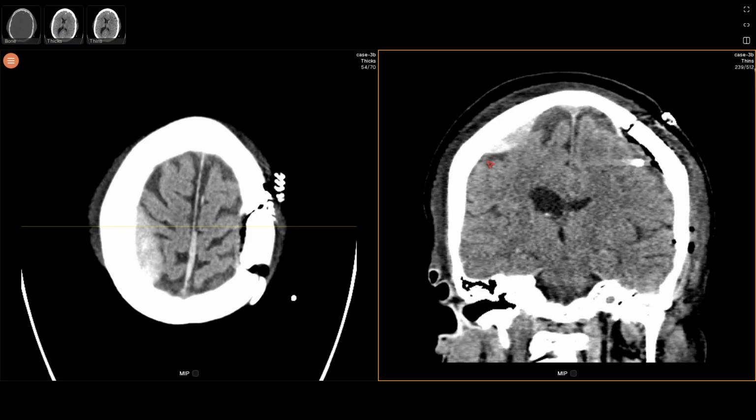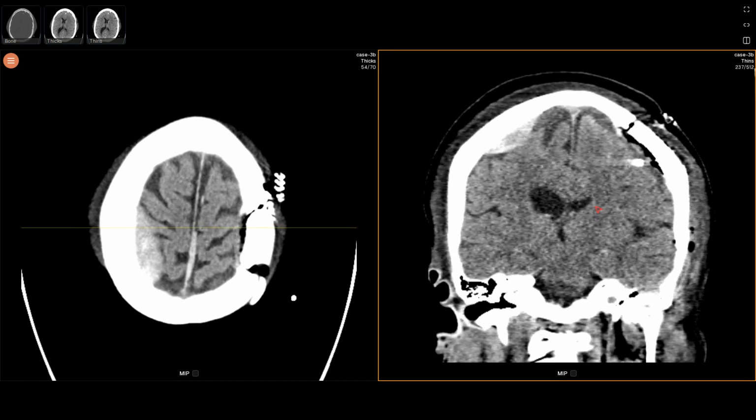in location. The only thing being this patient was obviously in the hospital this whole time, and it would be pretty odd for an epidural hematoma to sort of develop, a day or a couple of days, I believe, after this thing was drained. So that was the only sort of red flag that this might not be epidural in location. And in fact, when they went to surgically evacuate this thing, because they thought it was epidural, there was no blood in the epidural space. It was only after they pierced the dura and went to the subdural space that they managed to evacuate this particular blood. So this is really a subdural hematoma that's mimicking an epidural hematoma.